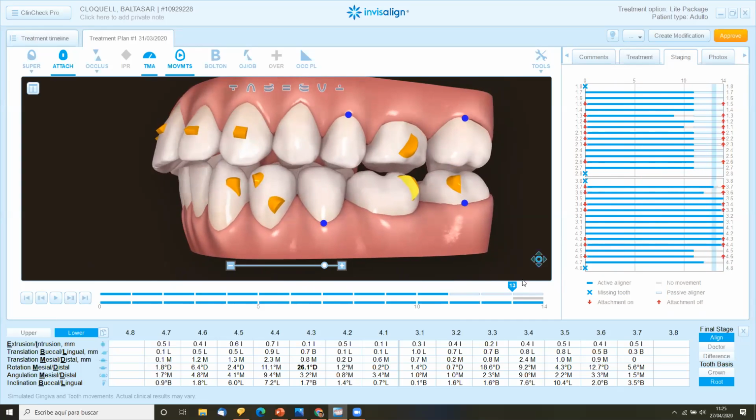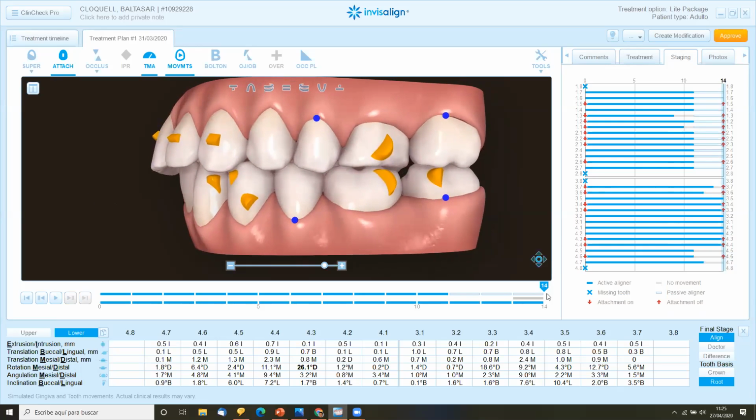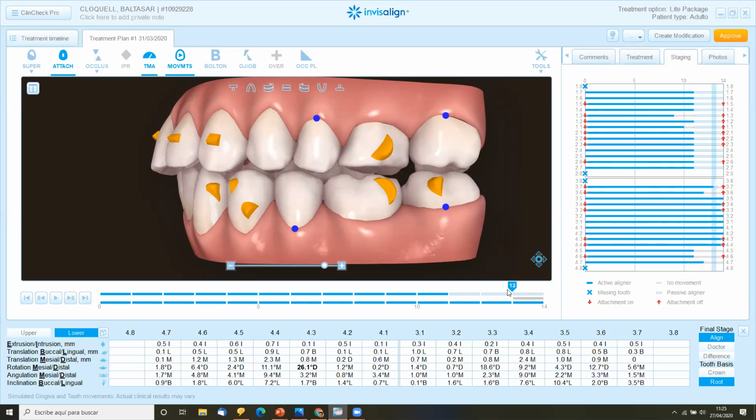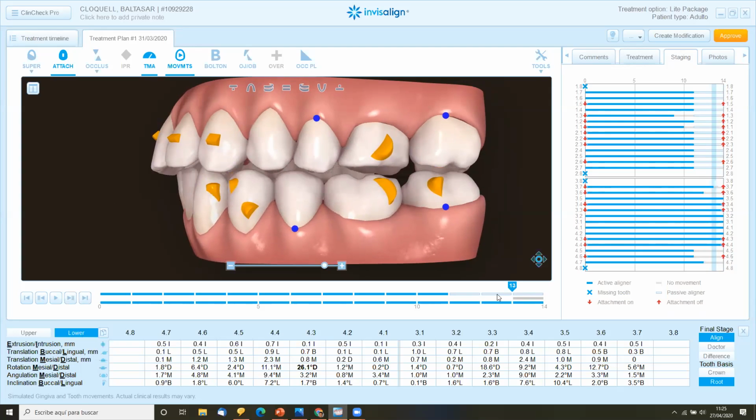Look, if we really want to intrude the posterior segments, we are not going for a light treatment. We go for a comprehensive one. And what we have to know is that this is not real, okay? The mandible doesn't go upwards like if you are going in an elevator. The mandible autorotates, going also forward, okay? Upwards and forward.